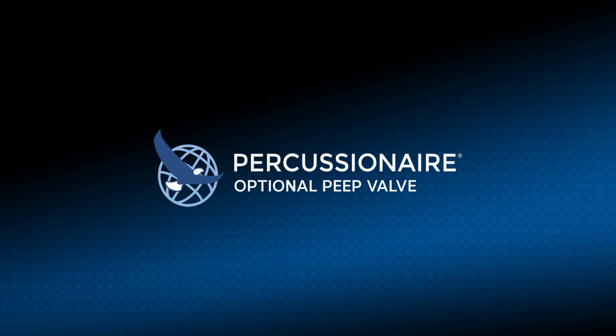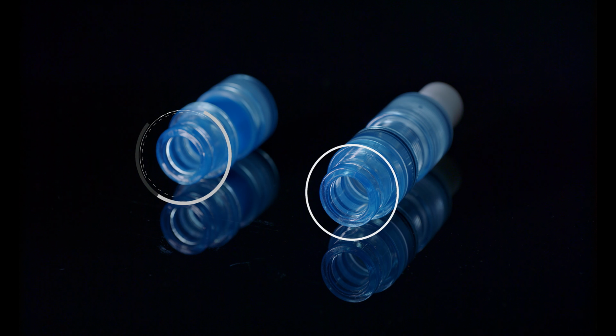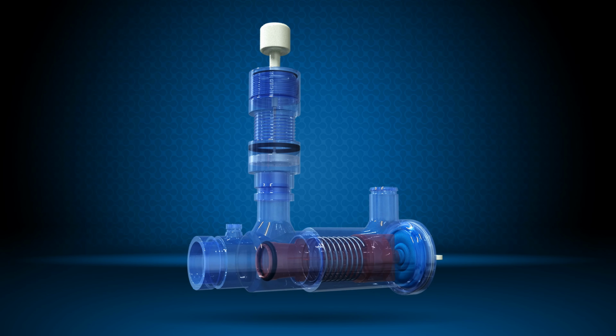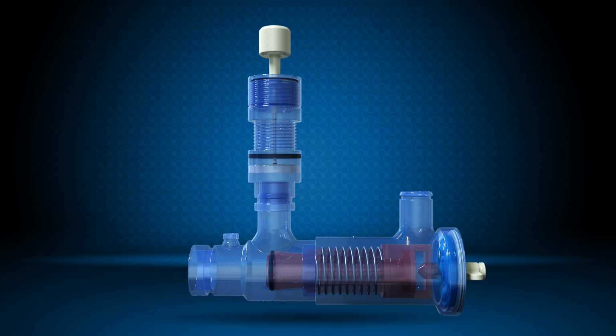Optional PEEP valve. A clinician can add the optional circuit kit that includes both a PEEP valve and a one-way pressure relief valve. The Percussionaire TXP5 has the ability to add a separate PEEP valve and one-way valve if PEEP is desired. It is available as a separate purchase, as all patients may not require it.